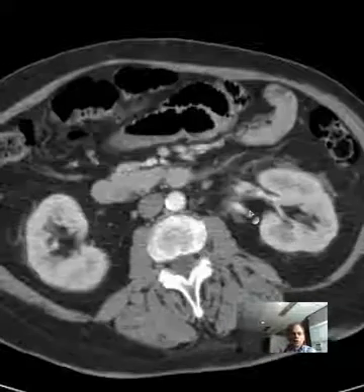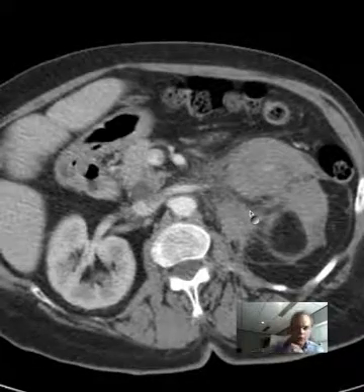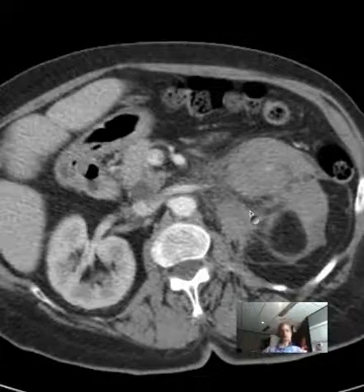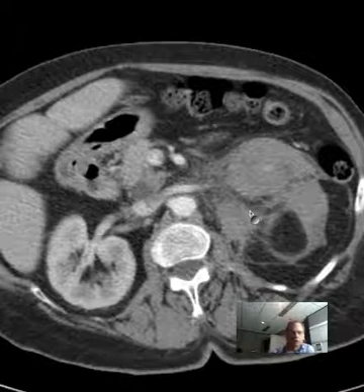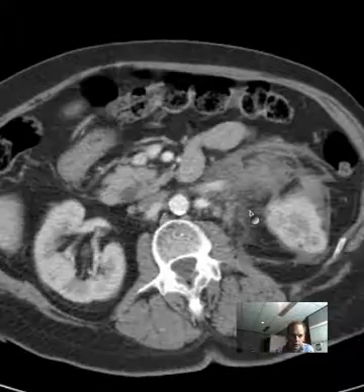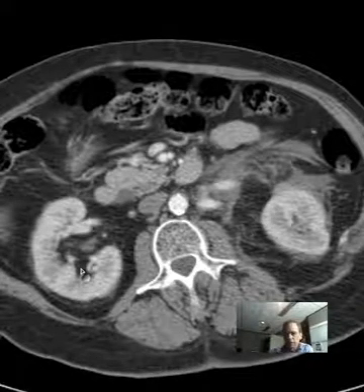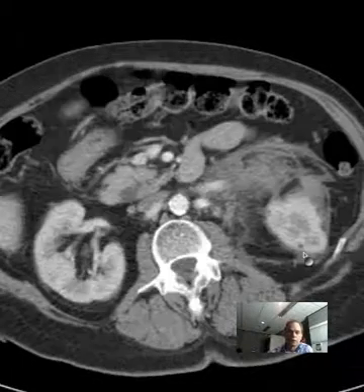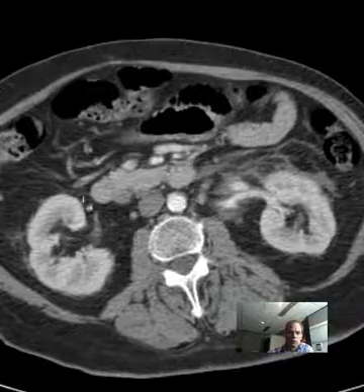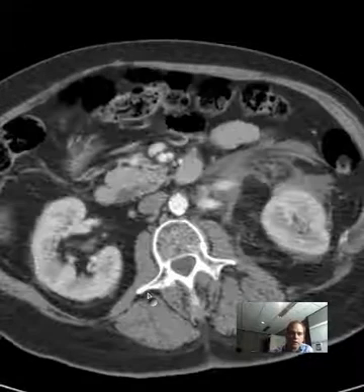Okay. So what is abnormal? There is an abnormality. What's abnormal? You kind of find yourself sometimes lost with where to begin. So the space that is involved is the retroperitoneum, and I think you can see that very clearly here. You see the kidney is a retroperitoneal structure. It is in the perirenal space, and you remember that there's an anterior pararenal space and a posterior pararenal space.